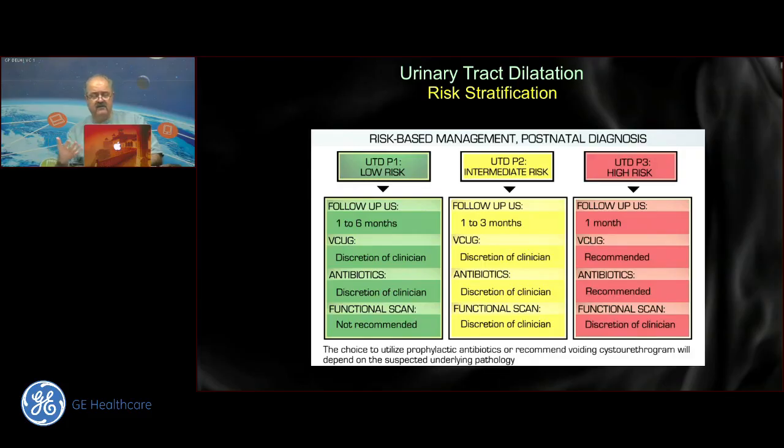But the fact remains that if the fetal weight is on the 93rd centile, that's normal. Kidneys at 41 to 43 are relatively bulky, but that's in the normal range. I may not even mention it. I'll just say, okay, come back again at 36 weeks so that we decide whether there is a Beckwith-Wiedemann. I'd look carefully at the tongue to see whether there's a big tongue or not. I'd like to look for some of the other causes. I'd like to look for the mid-arm circumference as a measurement, but I really would not worry too much about it. It's a question of how you convey.